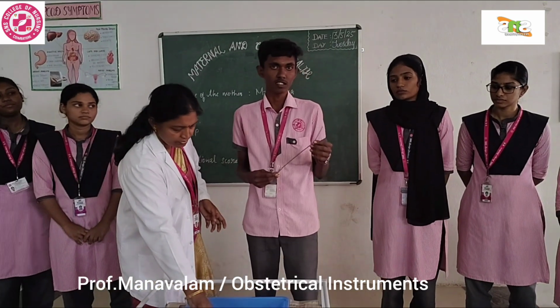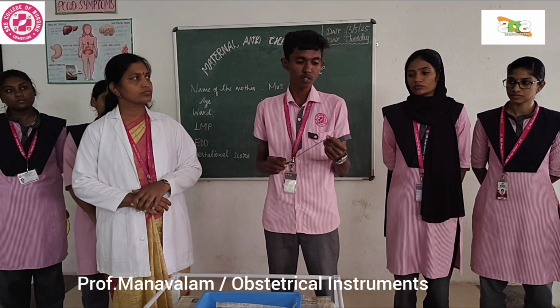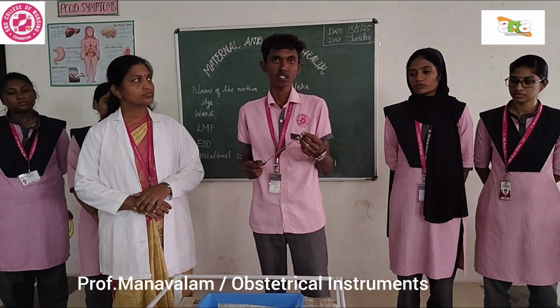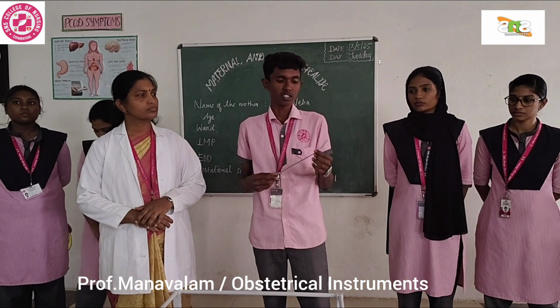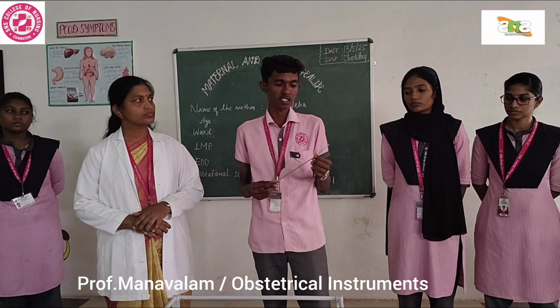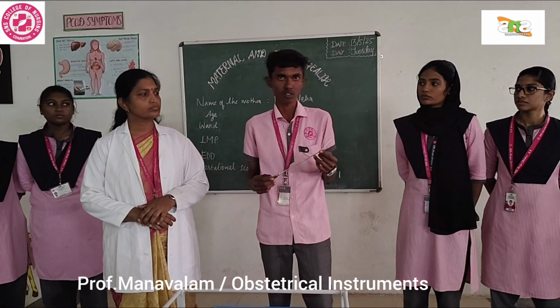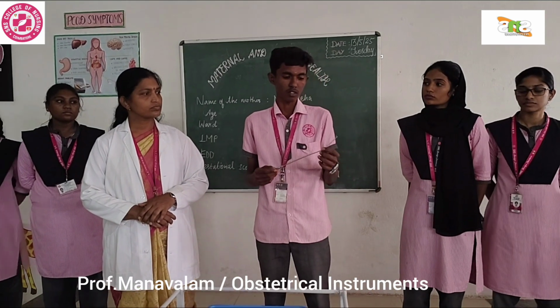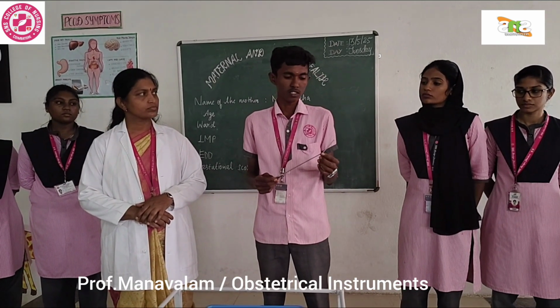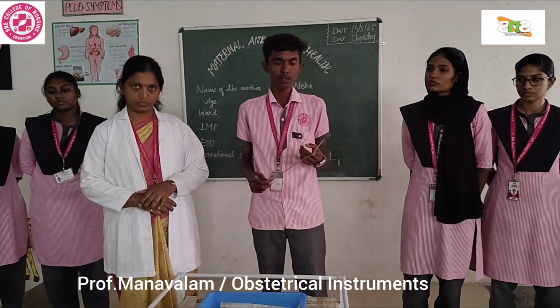This is the metallic uterine sound. The curved shape helps in adapting to the shape of the uterus and for easy insertion. It is used to detect the shape and size of the uterus before dilatation and curettage, and to detect any presence of foreign bodies.